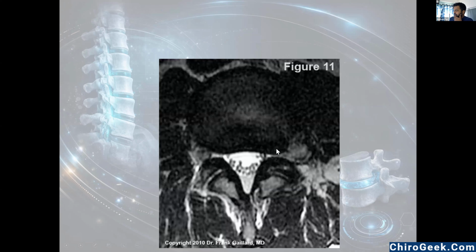Here there is another image where there is a paracentral or lateral bulge, a foraminal bulge you can see, and the ligamentum flavum is also thickened and it is causing stenosis. And any other finding are you seeing in this?